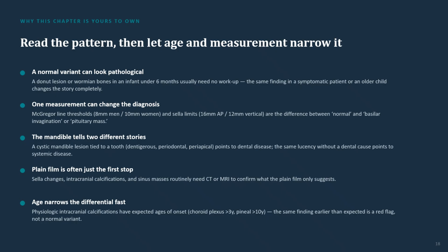So another thing to remember is that the x-rays may identify that something looks abnormal, but that patient may need advanced imaging modalities like CT or MRI to help diagnose what the underlying disease, cause, or pattern is. So even though we're trying to learn how to recognize a pattern, we have to take into account the patient's age, the location of the pattern, and also measurements to narrow down what possible diagnosis the patient will receive.